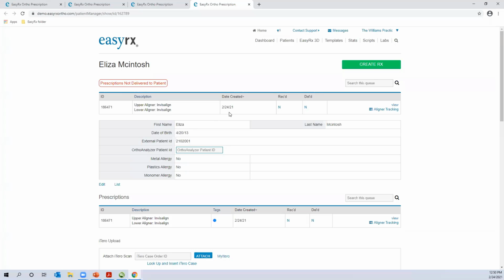Or if it's a prescription and we want to just check on the prescription, see if it's received back from the lab, for example, you can do that very quickly. So there are some quick links we'll show you. And at this point, let's open it up to any questions that anybody has.